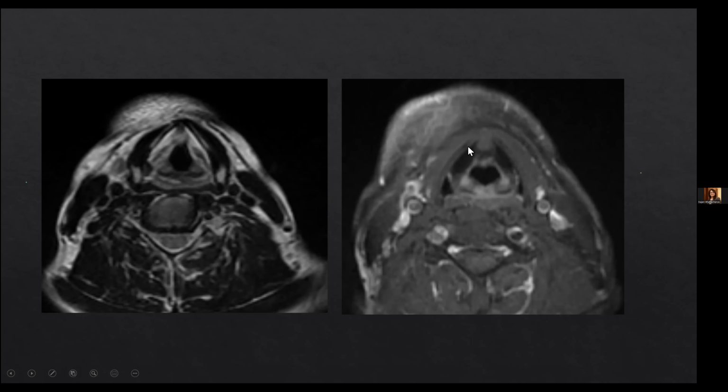So this part, which was the ossified part of the cartilage, again looks like this, and that is the fat. This is also of slightly intermediate intensity, as we can see in the subcutaneous fat. So this is the fat, and this black line which is surrounding it is the ossified part of the cartilage. So cartilage which is ossified, that looks like a bone, will always look black. So the cortex always looks black. The fat will look like the subcutaneous fat. Actually it is difficult to differentiate on a post-contrast fat sat sequence whether there is cartilage involvement or not, because the soft tissue and the fat start looking similar. So when we are looking at cartilage involvement, we should always look at high resolution axial sections, non-fat sat T1 and T2 sequences for identification of cartilage.